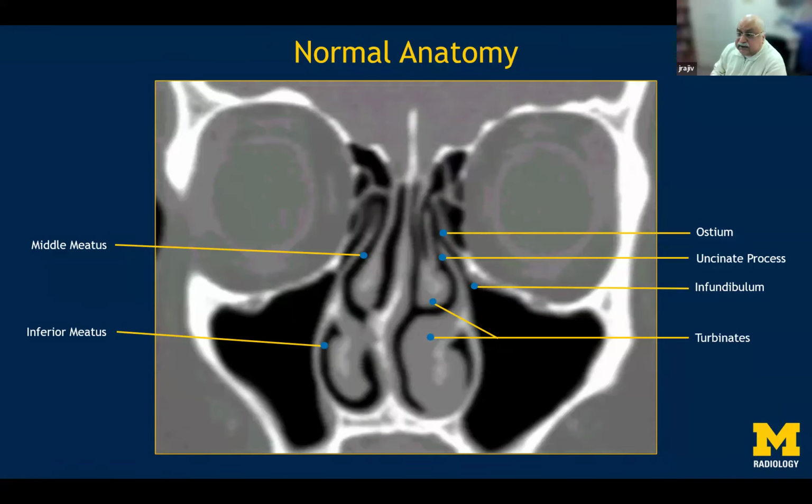the orbit, and that determines a lot of manipulation on the part of the surgeon so that he can get a clear plane of cleavage to open the ostia of the maxillary sinus, and also then make way for looking at the anterior surface of the anterior ethmoid air cells. So it should be very clear from this.